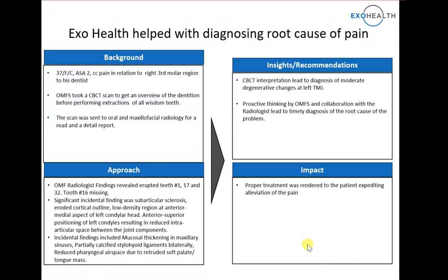This is a 37-year-old female patient who reports with a pain in the right third molar region. The patient is referred to the oral maxillofacial surgeon for the extraction of the third molars, and the surgeon took a CBCT scan just to review the dentition before performing extraction of all the wisdom teeth. The scan was sent to the oral maxillofacial radiologist for a read and a detailed report.